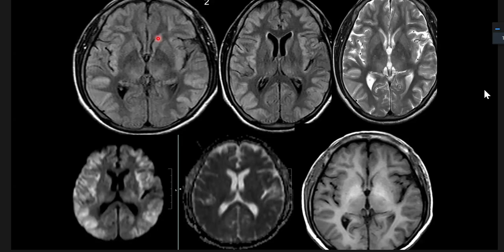Could be, sir. Very good. What could be? Why is this not and why is this yes? What could be the DDs to this? So basically, you are saying I have a complete cortical swelling, bright on FLAIR images, with involvement of the cingulate gyrus, insular cortex, and thalamus, with preservation of the occipital lobes. So what are your DDs?